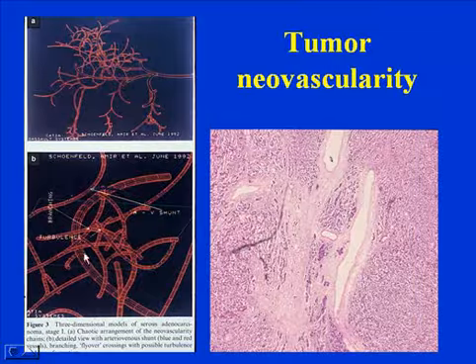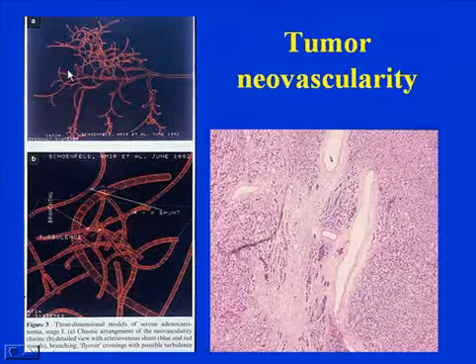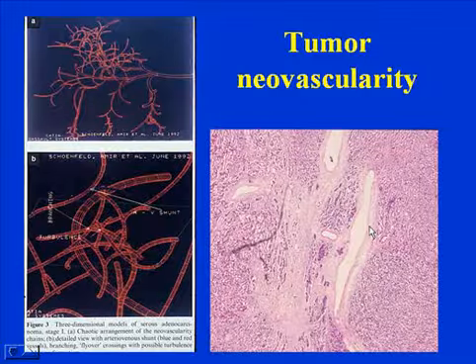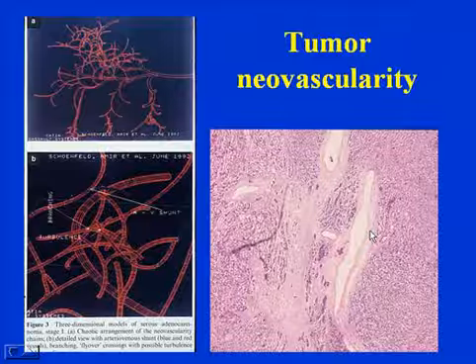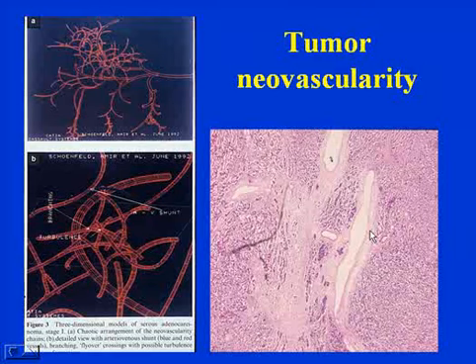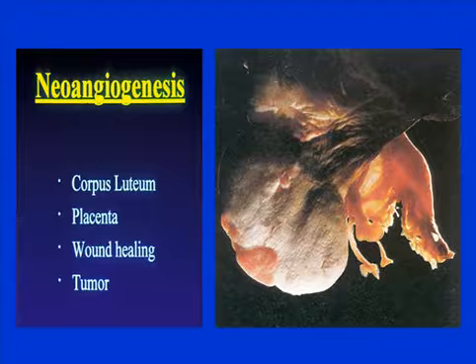There are arteriovenous shunts, there's a tangle of vessels, as we can see here, and these vessels lack a muscular media, as shown histologically here. So one would think that their Doppler signals, and as we can see with contrast, their entire flow pattern is different.